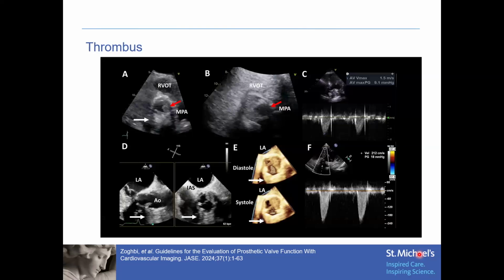And contrast that with thrombus, often not quite as echo bright. However, in image B here, this is a patient where, I guess in image A on the left, some of it may look somewhat bright. In the bottom image there, that's actually more so shadowing, an artifact from the top annulus. The thrombus is what's shown in the red arrow. One option would be to use echo contrast, and using echo contrast can often delineate thrombi because they end up being quite dark, in opposition to pannus, where the deformity or the abnormality is quite bright.